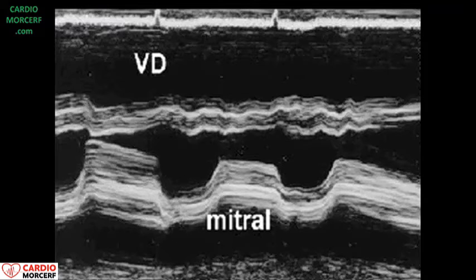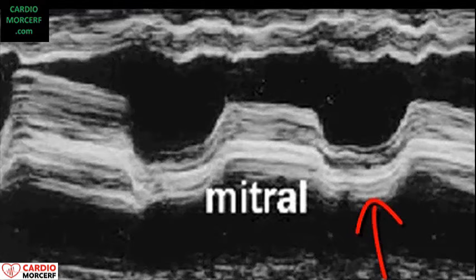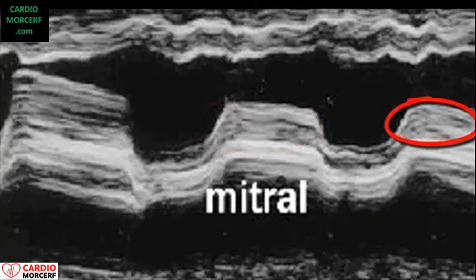Watch this M mode of a calcified mitral stenosis. There are lines here from calcium, but also regions where you see no perfect lines, but the smudge in certain places and also the torn paper sign. So there is endocarditis. These signs have to be searched for with M mode.